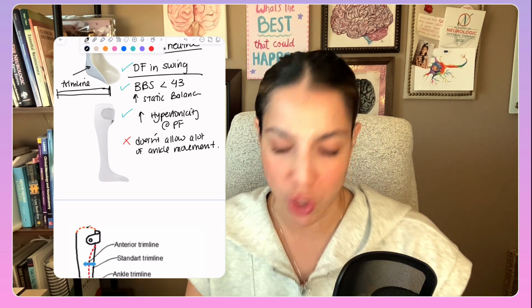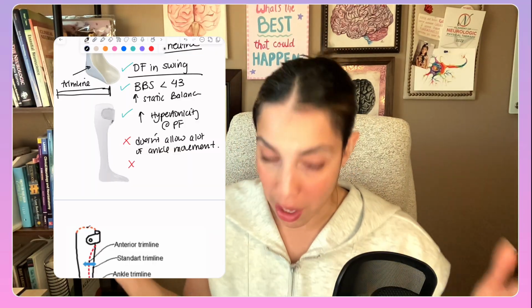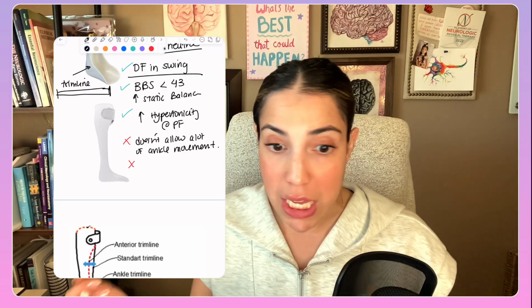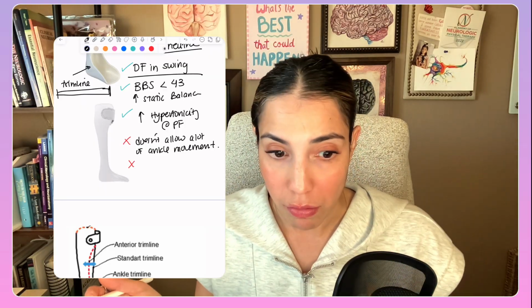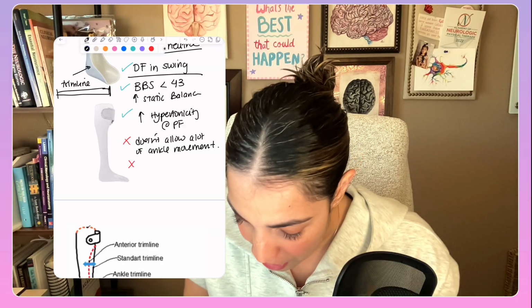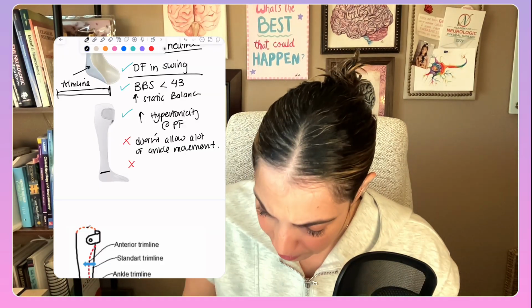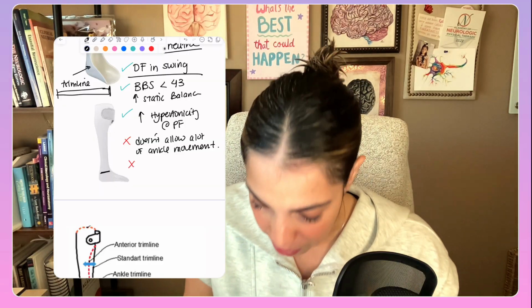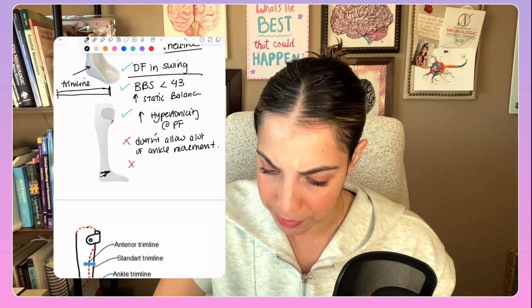Okay. So it doesn't allow a lot of ankle movement, meaning these do not contain an articulated ankle. Some similar solid AFOs might have an articulated ankle.